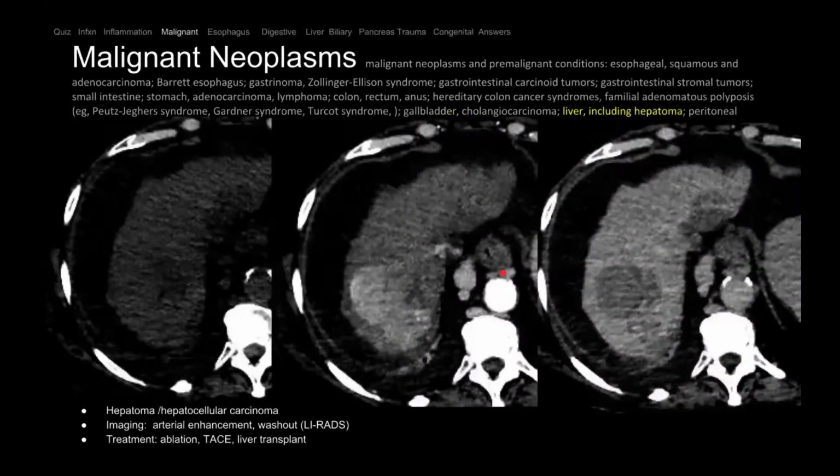All right, so keeping in the same region, this is a mass that's in the liver rather than in the CBD that we saw the slide before. So this says non-contrast, everything's dark, the aorta is dark. This is contrast enhanced. There's arterial enhancement and venous enhancement. And you see that on the arterial, this part is enhancing, right? It looks different from the rest of the liver. The liver looks abnormal too. It's very nodular, it's small, so the patient has cirrhosis.